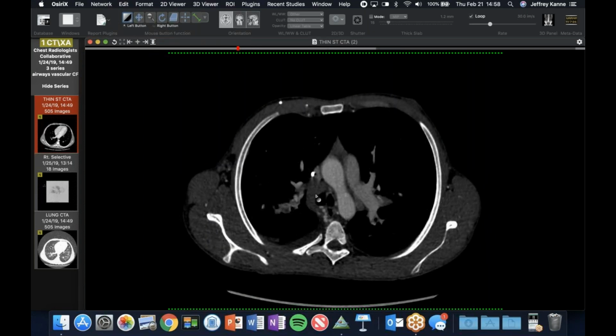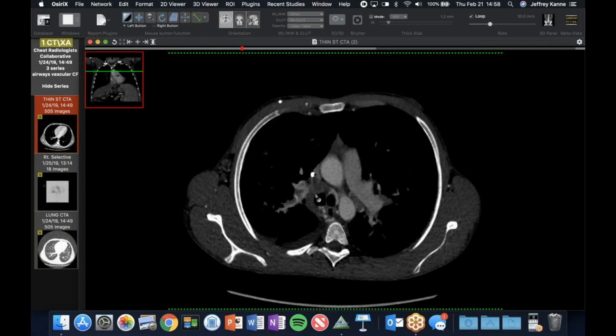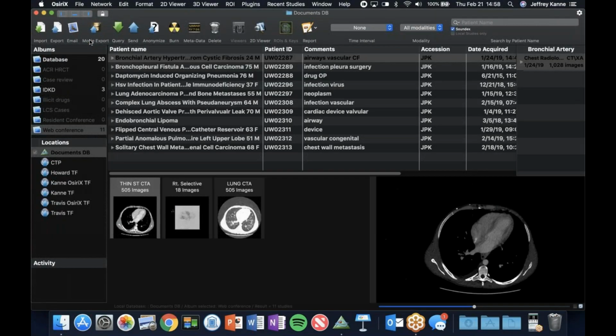Yeah. Well, because I think that's the point. One of the utilities of these studies too is just finding non-bronchial collaterals that they have to go after. Right. Right. Mm-hmm. Yeah, they don't always come off the aorta, so an aortogram alone may not be enough.